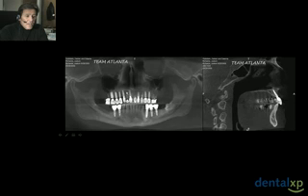And again, when we're able to place our implants and being able to now see them post-operatively and evaluating these concepts on CT, by post-op CTs, we're able to actually see in this patient that we've been able to maintain the facial bone as well as the lingual bone around these implants, and we start to evaluate how high up on these platform switch abutments are we able to maintain the crestal bone.